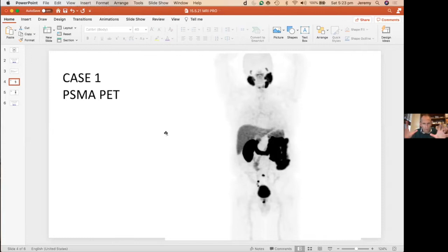So remember, we're really focusing today on some of the pitfalls of MRI, even though it's a wonderful test normally. But in the workup, once I'd done the biopsy and in the workup for surgery, we got a PSMA PET scan. And you can, again, see, I hope, on this image here, below the radiotracer accumulating in the bladder, the very avid portion right in the middle of the prostate here, but you can also see 3 positive lymph nodes.